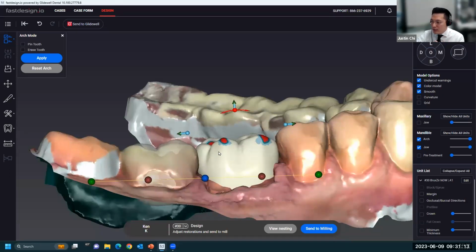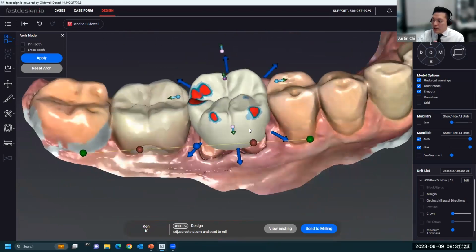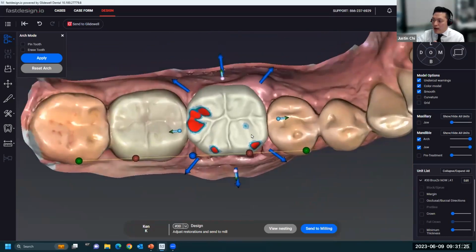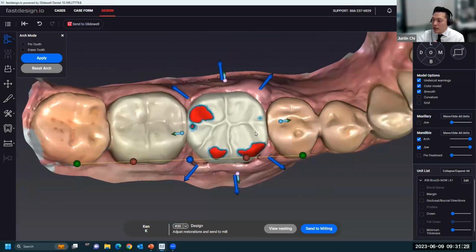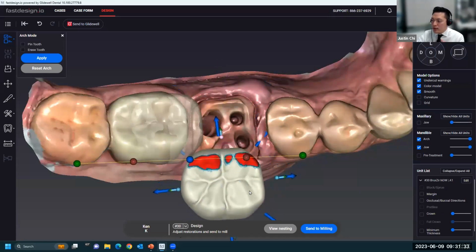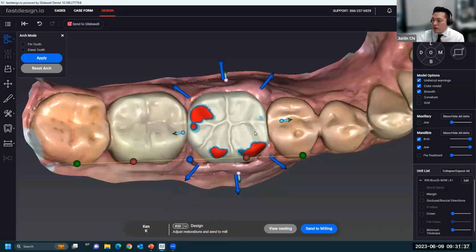So you can see that's about even there. The distal typically slopes down just a bit. So from this buccal view, that looks better with the angulation. Let me rotate back to an occlusal view here. And from the occlusal, we want to ensure that our library tooth is centered over the preparation, number one. So you can see if we're off center, reposition it, make sure we're about center over the prep.